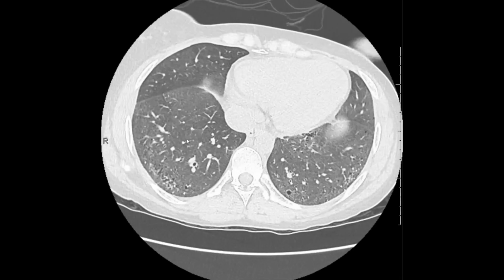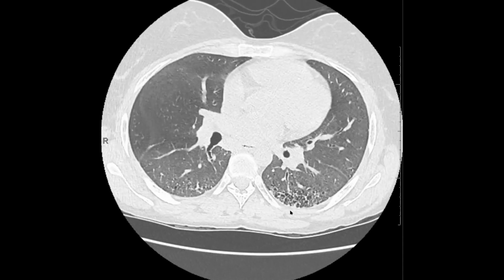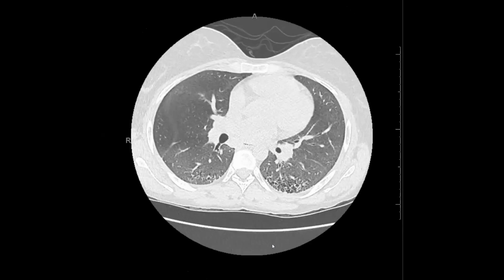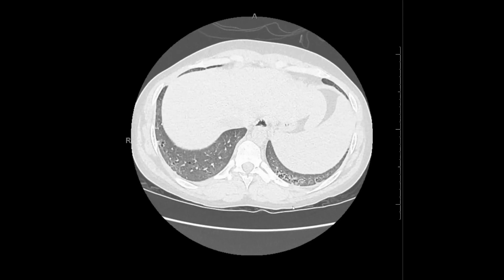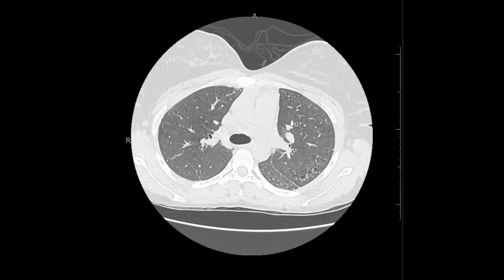And some ground glass opacity. There's hazy ground glass opacity within the lungs. I think that by definition, we would say there is some subpleural honeycombing. For example, in the left lower lobe, we see this subpleural cystic abnormality. But again, there's so many of these clustered cysts. You do think about connective tissue disease. Also, the fact that there is relative subpleural sparing here makes you think about connective tissue disease on top of the ground glass opacity. This patient does have systemic sclerosis.